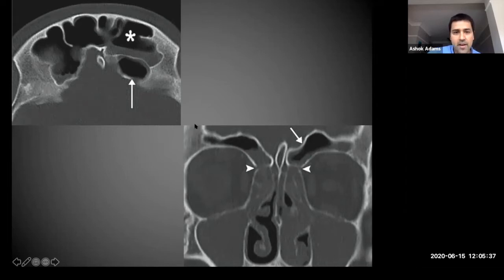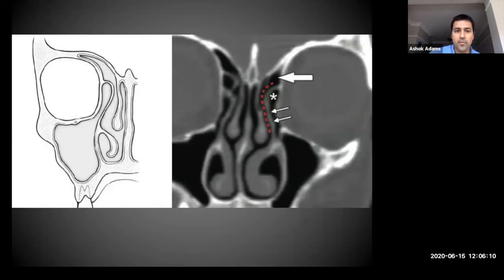Firstly, just to outline, you can get these additional supraorbital ethmoidal air cells, and I tend to comment on these mainly because of the relevance in terms of the anterior ethmoidal artery. I will typically comment whether I think the bony channel for the anterior ethmoidal artery is incorporated into the anterior skull base, or if it's surrounded by either aerated or opacified air cells, mainly because of the potential risk of injuring the little channel and causing an intractable intraorbital hemorrhage. This is one of the anatomical variants that we'll always comment on when I'm talking about the frontal sinus drainage pathway.